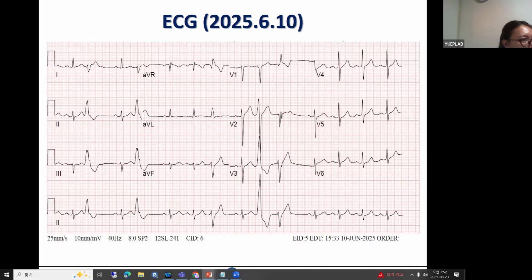Now if you look at the RBBB aberrancy, from this QRS complex to this R, and this to this R, this is longer. The RR, if you measure, I think is longer. That's maybe why, when you have a longer coupling, you have more, like the first PVC in the previous ECG. So the question is whether this would be a different preferred conduction through the right side septum that we cannot tell, even though there's a P wave notching here.